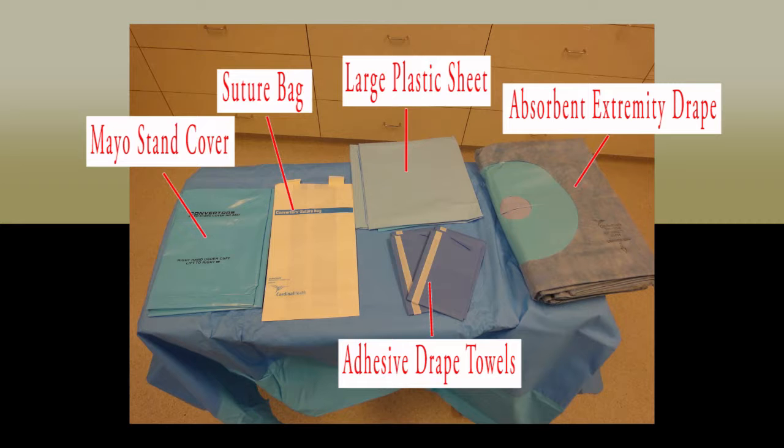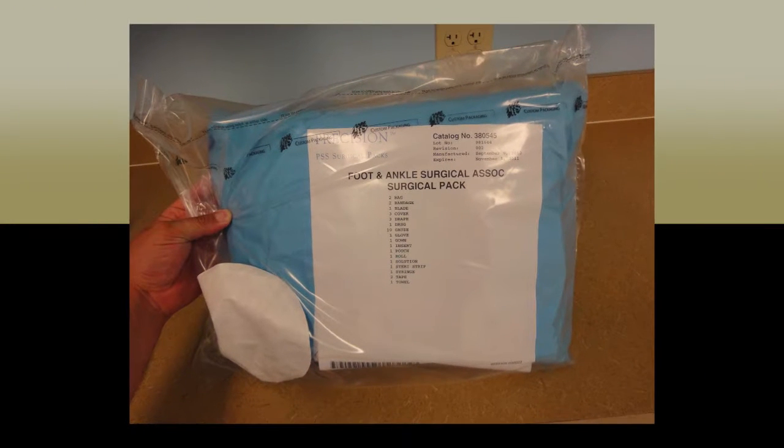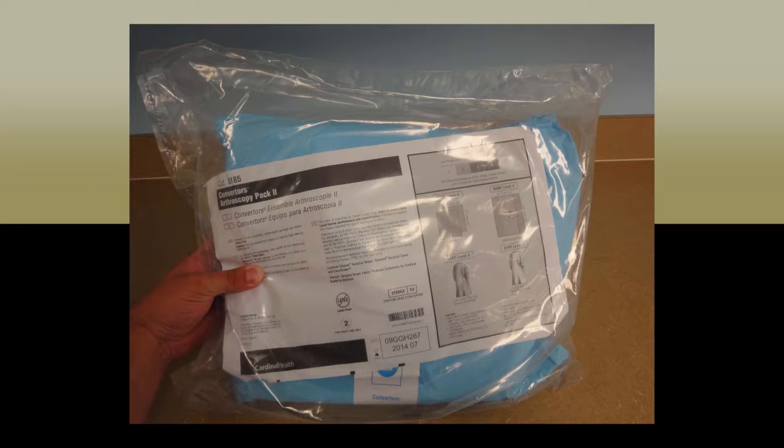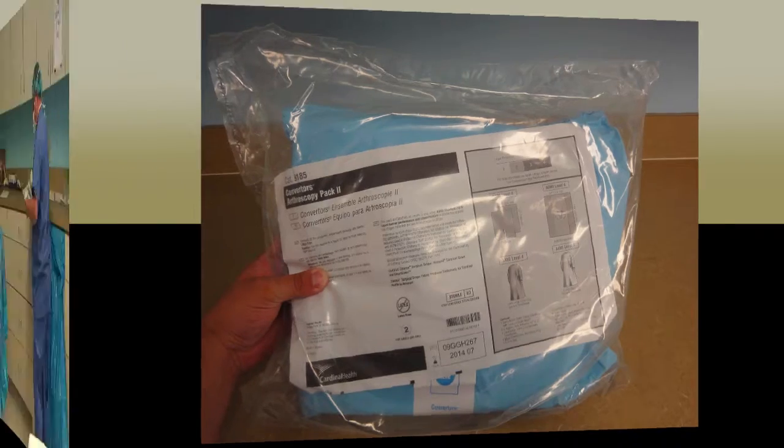Most cases involving procedures of the foot and ankle will require the use of the pre-done extremity pack. This pack contains the same materials listed above for the EPF pack. However, it is pre-packaged with other materials such as a blade, bandaging material, gauze sponges, gloves, a gown, steri-strips, Adaptic, and sterile solution. When doing an ankle arthroscopy, you will need to use the arthroscopy pack, which is a more intense pack. It houses more materials and different draping to be used during ankle stabilization cases.